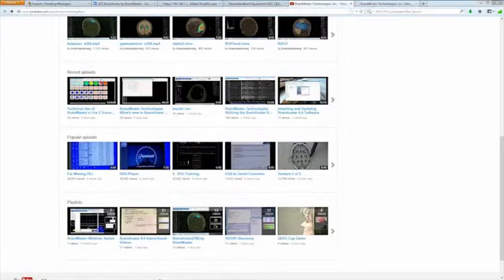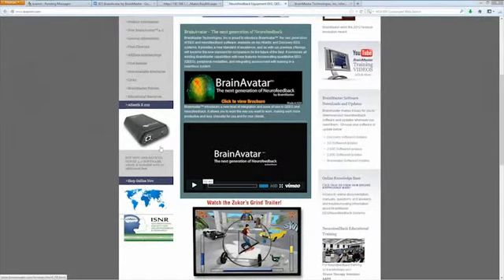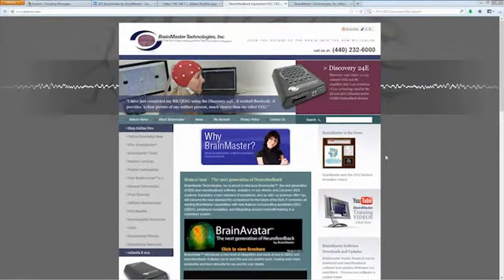Of course, the other place that is a great tool, and I'm going to show you real quick, we're on a specific tab because I'm going to go to that here in a little bit, is the knowledge base. Whenever we get different fixes, different bits of information, different articles, things like that, we are going to put them in the BrainMaster knowledge base, which is at www.brainm.com/KB, which you can also get from the BrainMaster main page right here under the online knowledge base, which you can click here to view. It works on keywords, of course, if you're looking for something in particular.